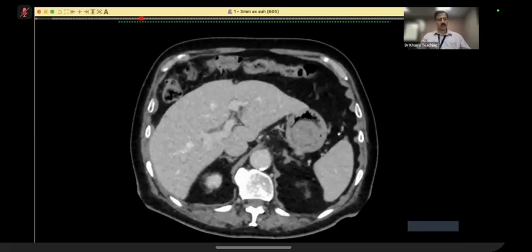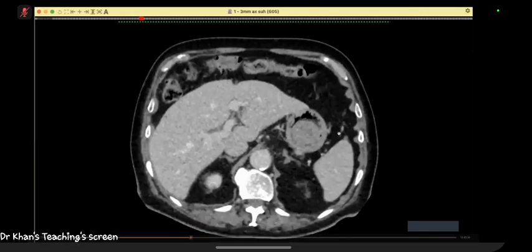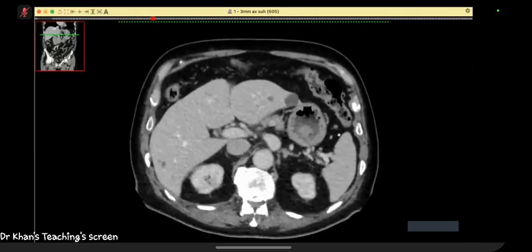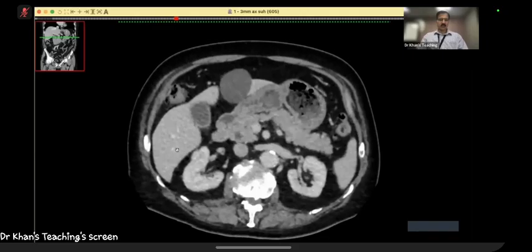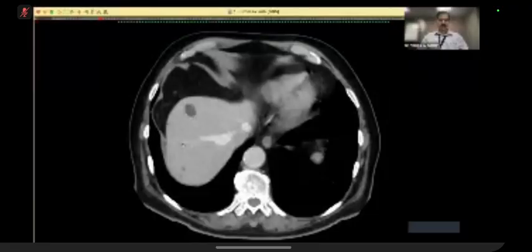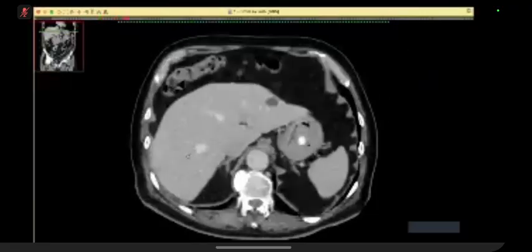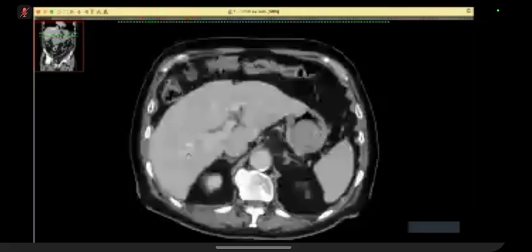You mean to say GIST cannot grow in the lumen? Yes. Okay. If it is growing exophytically, sir. Okay. This thing, you said that these lesions are metastases, and can they be anything else? Yes, they can be hepatic cyst or hemangioma. Okay. Just give me your conclusion.